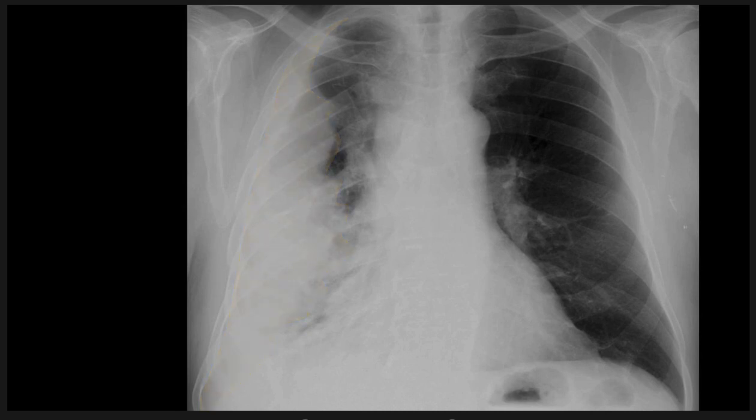If we zoomed in tight and looked closely, we can see that the ribs are normal looking. There aren't rib fractures that are healed there. This is bad. There's not a good explanation for this. There's some bad explanations for it. When you see something like this, you've got to get cross-sectional imaging to look at it.